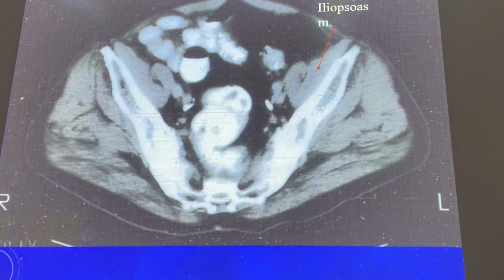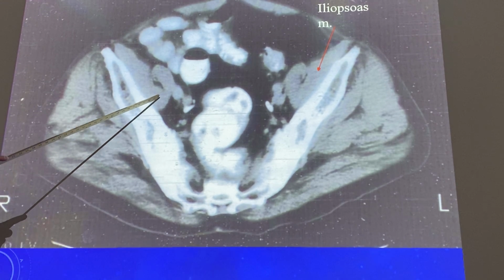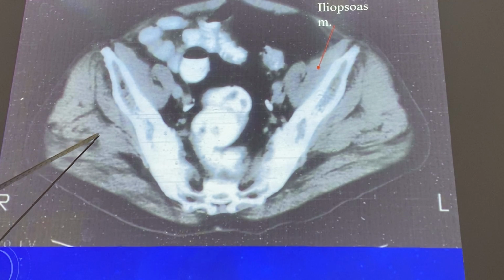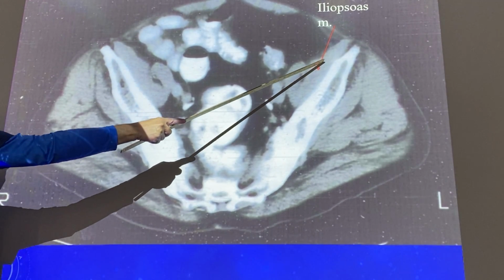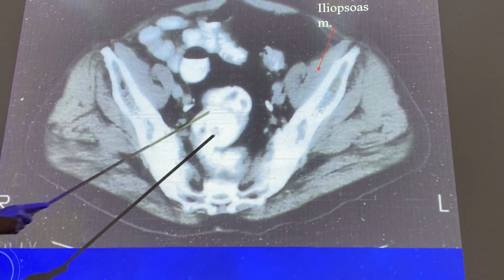Once again, now you have that transition, so you get somewhat of a unification of the muscles. From this point down to the area of the greater trochanter, now you're going to have the iliopsoas up here. These muscles will continue until they transition out. So you have over here iliopsoas, both sides. You have the gluteus muscles on the posterior side.